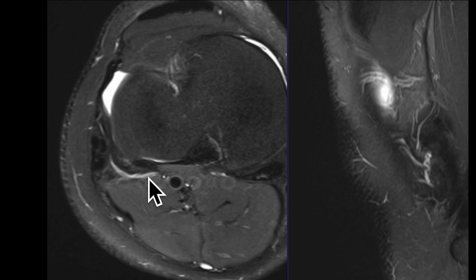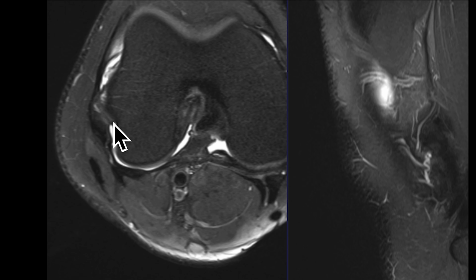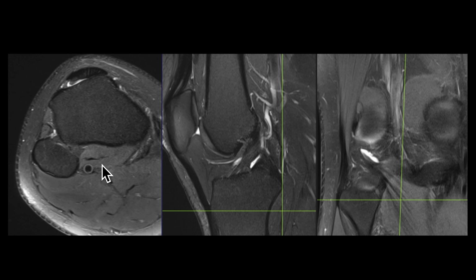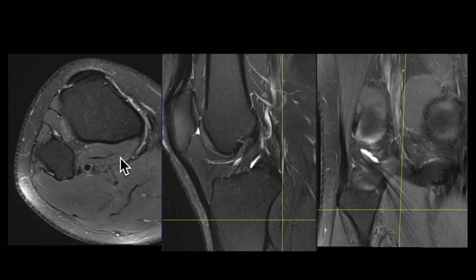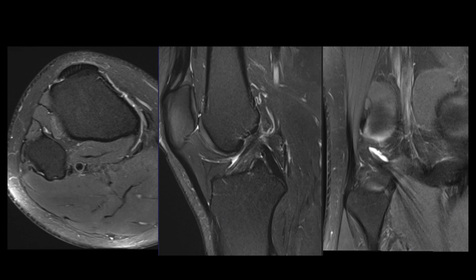You can see that it's starting to curve laterally around the knee, and it's going to attach onto the lateral aspect of the distal femur or the lateral femoral condyle. I'm just going to try and orient you here. So this is the muscle belly we're interested in here. You can see it right up against, arising from that posterior margin of the proximal tibia. So this is the proximal tibia here. This is going to be the muscle belly here. So that's just to orient you.